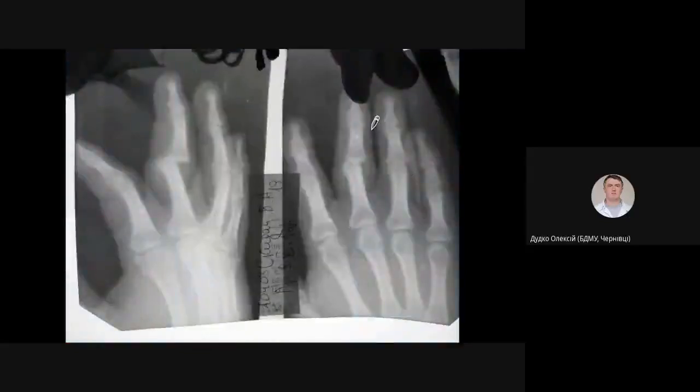That is another X-ray of a hand, and here we check the anatomy. You'll see that we have first, second, third, fourth, and fifth metacarpal bones. Then we have a row of proximal phalanges, and we don't see a bone pathology here.